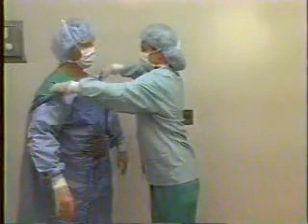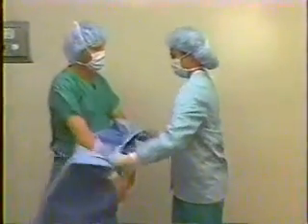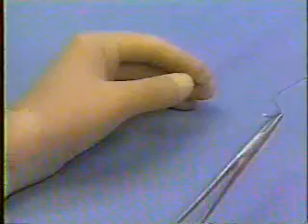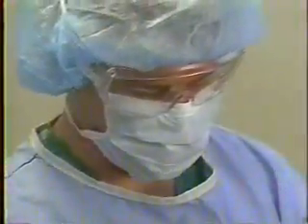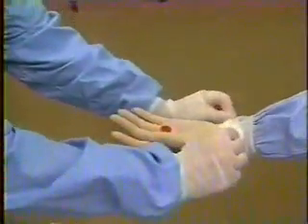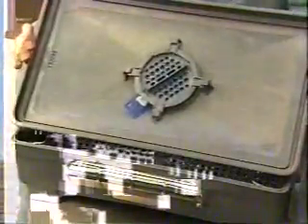Many of today's materials are fluid-resistant and antimicrobial, but may be punctured or torn. If a sterile barrier is mechanically disrupted, for example, a needle puncturing a glove, a surgical conscience will demand the situation is acknowledged and corrected. Hard container systems should have intact filters.